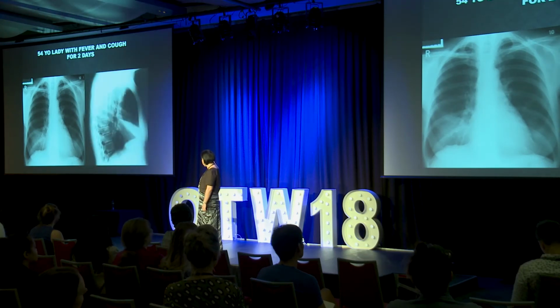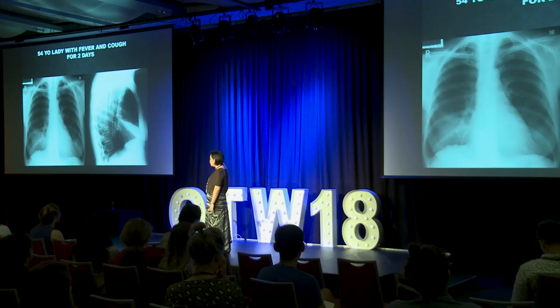And then you can see that lateral, a nice wedge shape. So that's the middle lobe. Is that the normal size of the middle lobe, do you think? It's a lot smaller, right, than you usually expect. So this is a middle lobe collapse. If it's consolidation, you shouldn't have any volume loss. It should still be the same volume, but just more white.